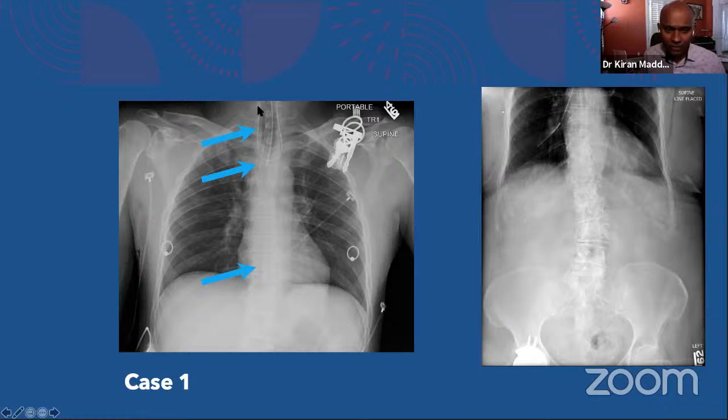So if you see, the patient also has another tube. Usually it is the NG tube. I cannot comment because I'm not seeing the tip there. But if you see, it coils back in the proximal esophagus, and it is going back. So this is a coiling back NG tube within the proximal esophagus. Probably the clinician might know, but still you have to give them a call and let them know.